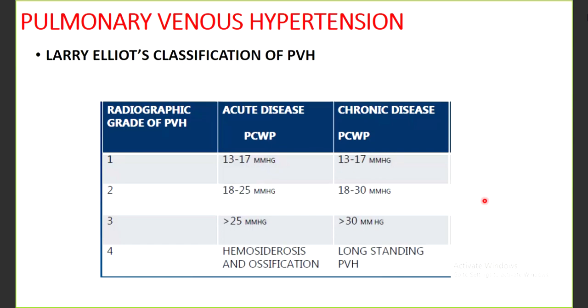But more or less, it has been staged into 4 grades, wherein the earliest stage, the X-ray evidence progressively worsens, and we will see what is happening.